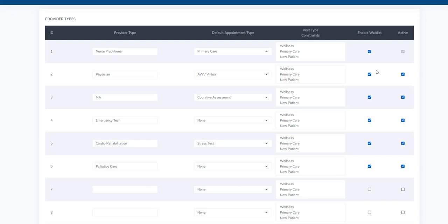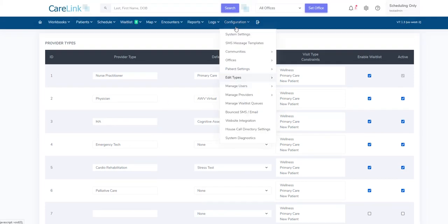A lot of our customers that have a medical director, nurse practitioner, or mid-level will have a medical director provider type and then a physician or nurse practitioner type. A lot of our newer practices also have a technician or medical assistant type. Maybe these are the folks that go out to patients and help with their telehealth appointments, or they may go out and do education or rehab or maybe non-medical interactions with the patient that you also want to schedule in your CareLink account.